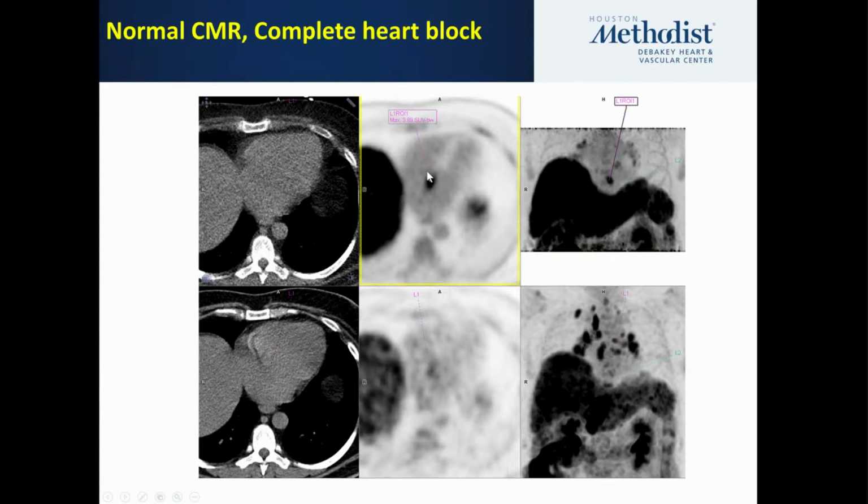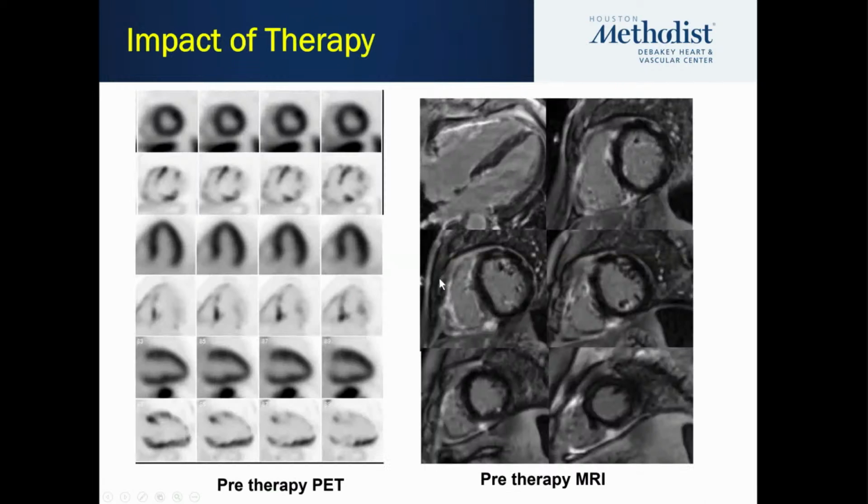This is a patient who has an uptake probably just at the AV node, resulting in complete AV block. This is not the entire AV node; because of very intense uptake, you see it like more of a light blooming, so it's a little bit bigger here, but this is exactly where the AV node could be.